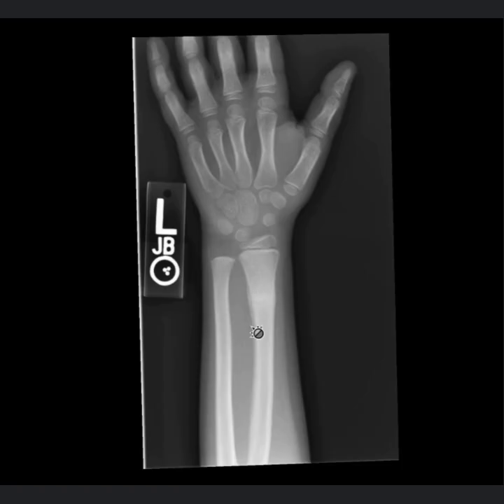And again, you could see a lot of good cortical healing on all 4 cortices here, remaining in a stable position. So in a 7-year-old patient, typically 3 to 4 weeks in a cast, followed by 2 to 3 weeks in a splint and/or a brace that they can remove, and then they can progress back to activities and usually full healing.